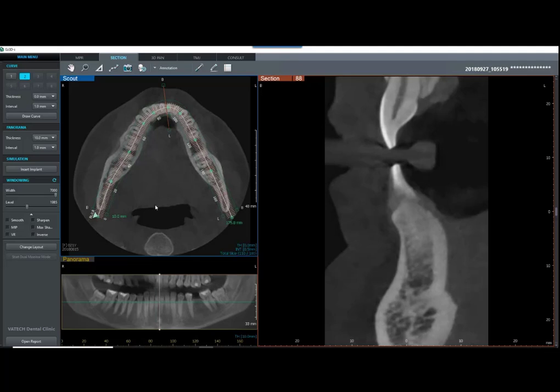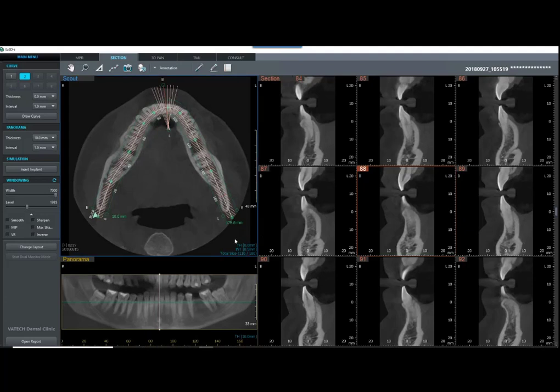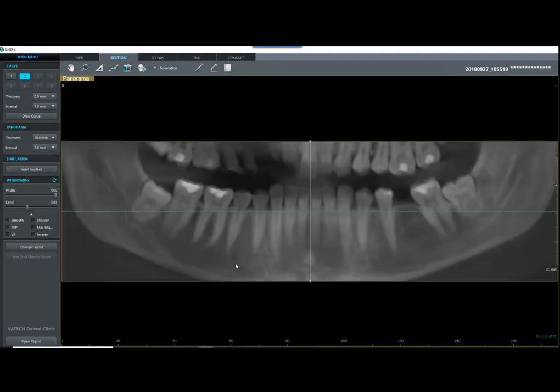So right. And I assume we can make that a little bit larger as well, so we can see more of the upper quarters. Right. So if we want to change the height of this pan, there are some settings in there. Right now it's set for 5 centimeters. What we can do is we can come here and change the height.